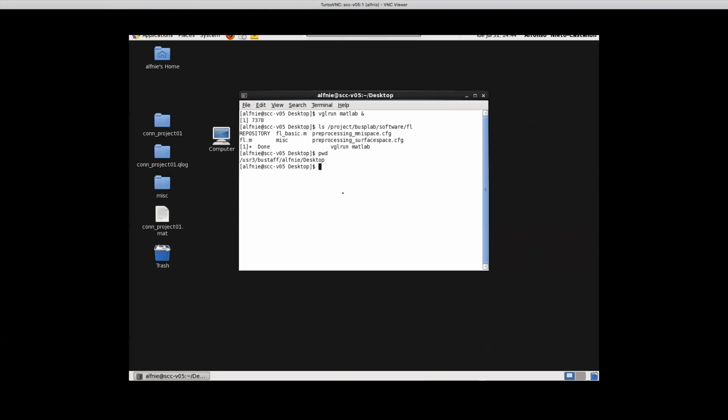So FS average interpolation is basically a way to resample the vertices within the surface of that individual subject, so that you get your data in standard vertices that, when inflated, look like a uniform tessellation in the sphere. So it's basically a resampling of your data within its own subject surface representation of the data. So I don't know if this is clarifying. So we could have imported the data. So the only difference is basically the number of vertices.